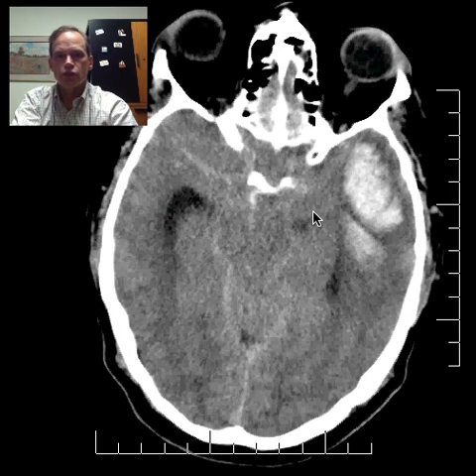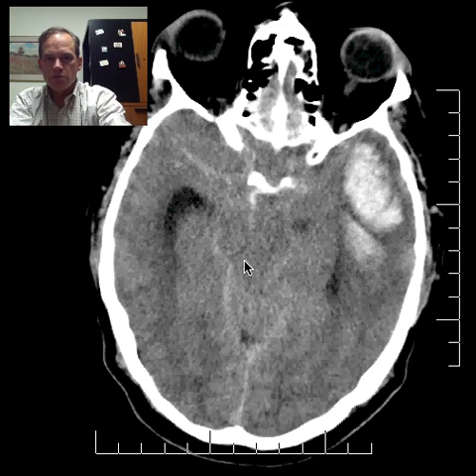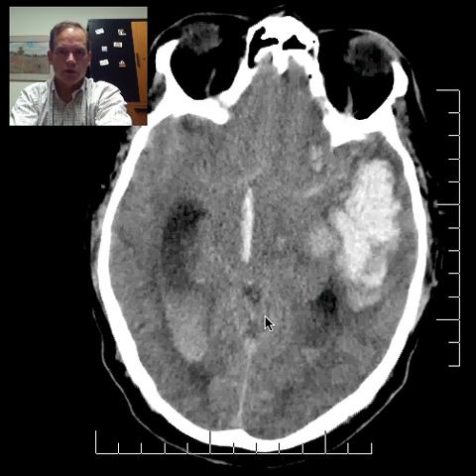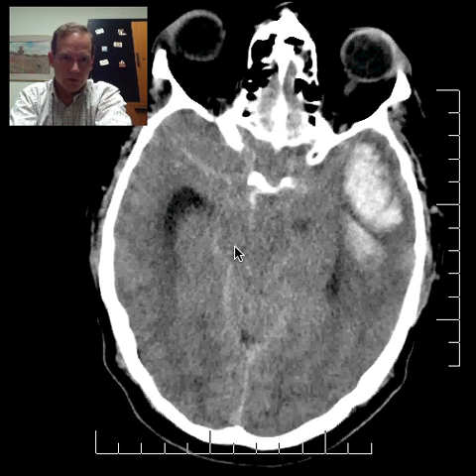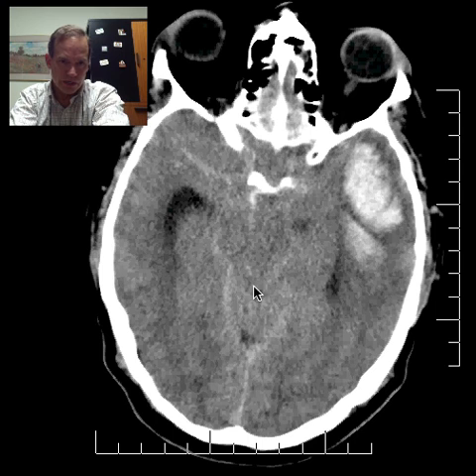It is the cerebral aqueduct. And you can make out a little bit of a hint of it there. So here we are in the third ventricle. You go down, and it's somewhere in there, but it's very severely compressed. I think you can see that. We'll come back to that.